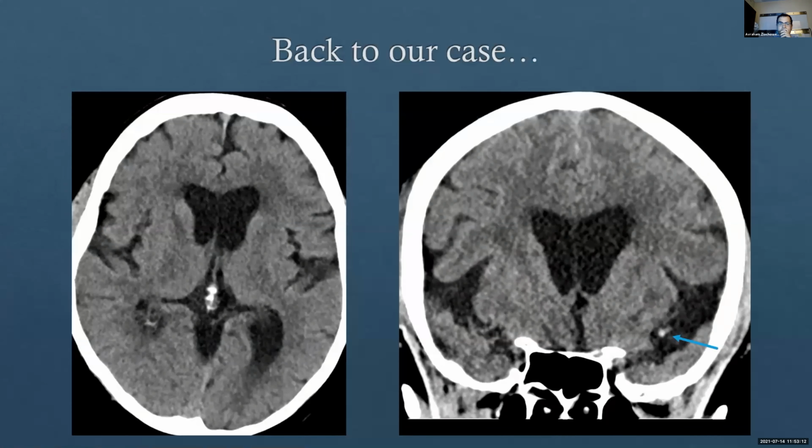Okay, so now let's go to the case that we talked about. Again, a 73-year-old woman who had right-sided weakness and slurred speech. If you look here on this CT head, you don't see any signs of hypodensity, or major loss of the gray-white matter. You can see this is a little bit gray. This isn't white, it's actually dark because we reversed it on CT. This is the gray matter, the cortex, and the white matter. We can see the difference between them well.